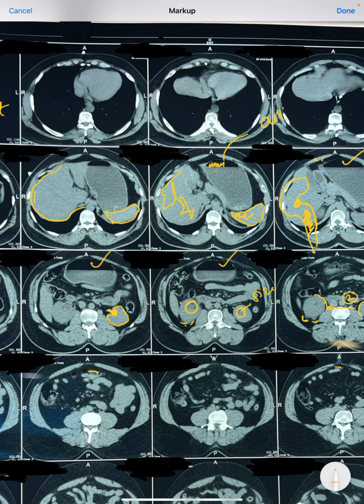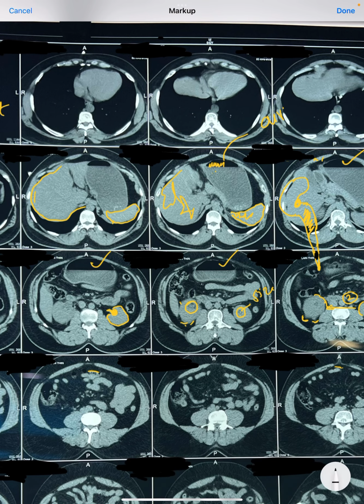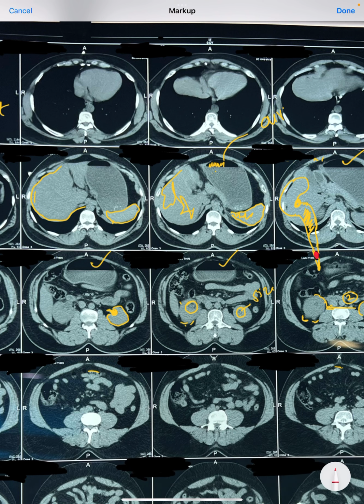But whenever there is hydronephrosis, why could hydronephrosis occur? That can be because of stricture in the ureter. There can be stricture, there can be a stone which is impacting here, stone which is blocking the urine. So if there is stricture, if there is any mass here, if there is stone, the urine will not flow down. So urine will start accumulating. So the ureters will automatically enlarge in diameter. So automatically urine will be accumulated here, and the pelvis will dilate.